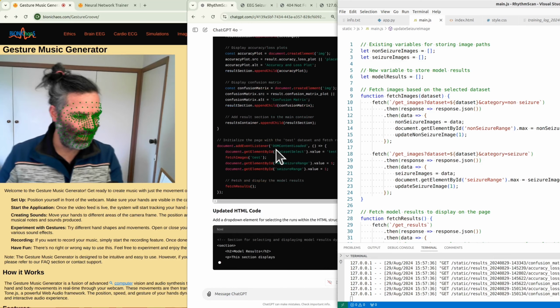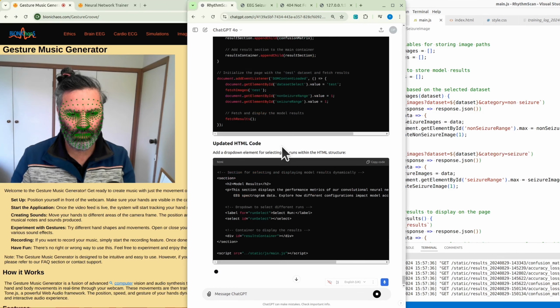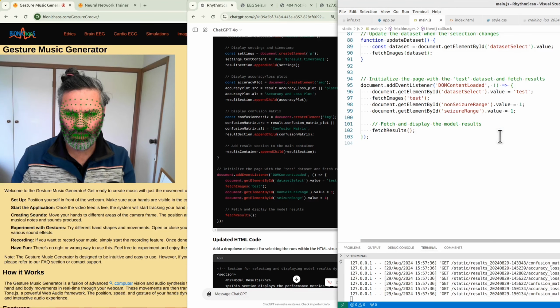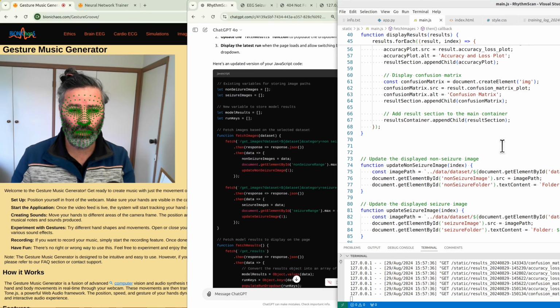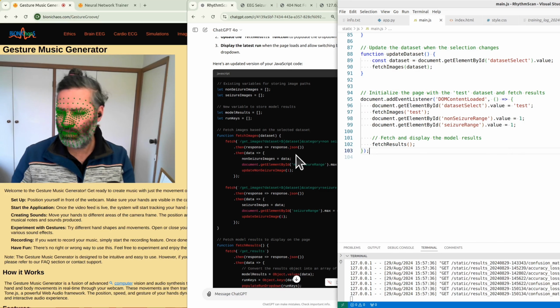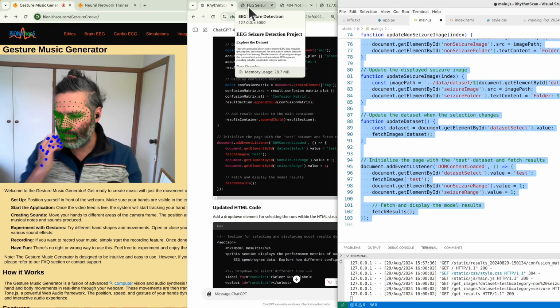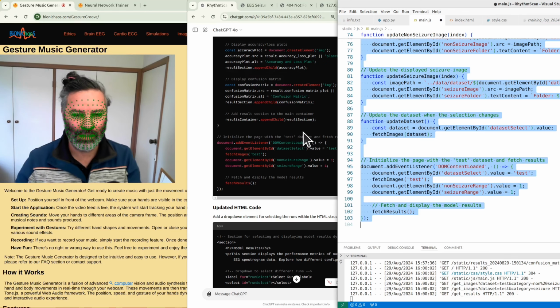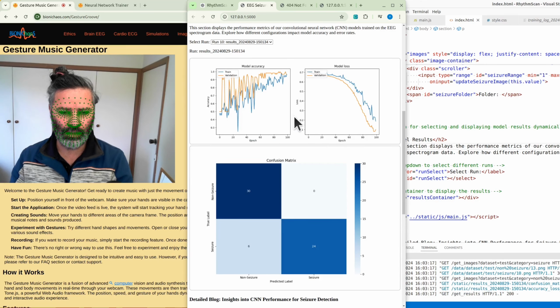Yeah, this is the problem when it's regenerating stuff. Could be tricky business. It generated the whole thing, or looks like it. I expect it to be slightly longer, 103 lines of code. Yeah, well, I was having trouble integrating. Okay, let's see. I'm not getting any errors.